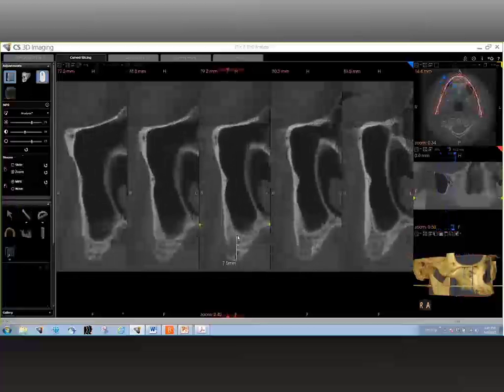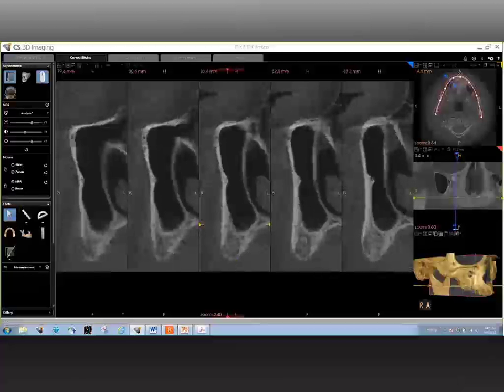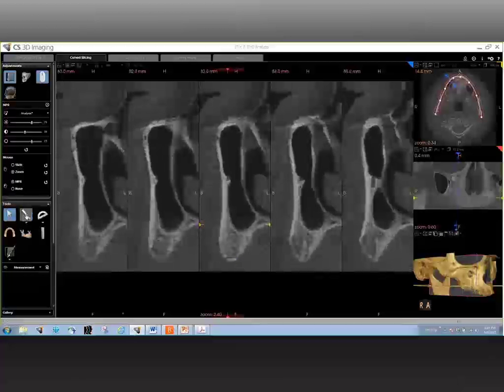And which seems like from non-existent, it has come to almost 8.4 millimeters, and as you go further anterior, you're able to even gain some ridge width there, in fact, which is actually very good for somebody who wants to get some sort of implant surgery done.